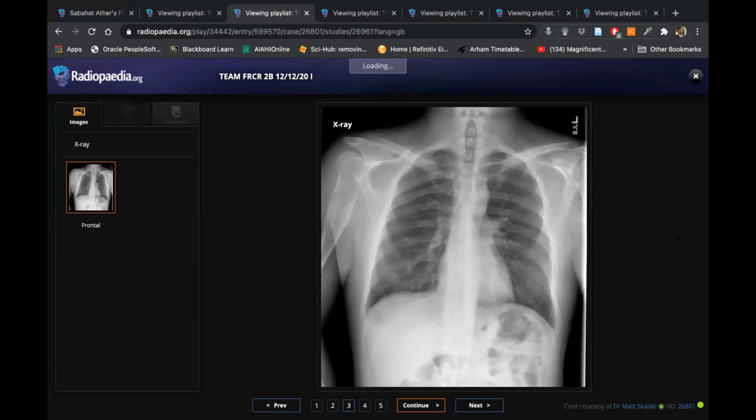So I'm provided with a chest radiograph, frontal projection, of a skeletally mature adult patient. I can see there is widening and sclerosis of the right humerus with surrounding increased soft tissue. So the patient has pelvic pain, if I'm not wrong. So going with the history, this bone appearance appears to be suggestive of a bony pathology, probably sclerotic bone mets. Can you again describe the bone findings for me?